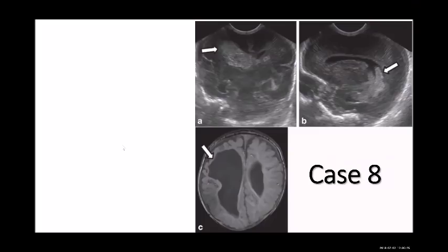Can we comment? Yeah, go ahead. With the coronal one, there is some white appearance, hyperdense, or I don't know how to describe. Look at here. Do you see this? This is the choroid plexus. Correct. But the choroid plexus usually ends here. There is something like choroid plexus, this one and this one. And the caudothalamic groove, if you know what it is, it's irregular.